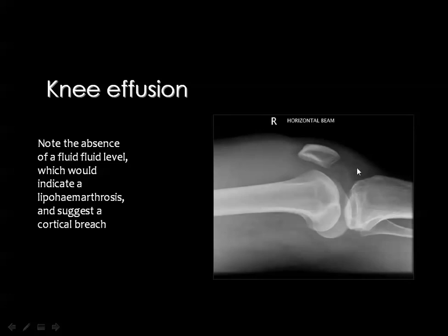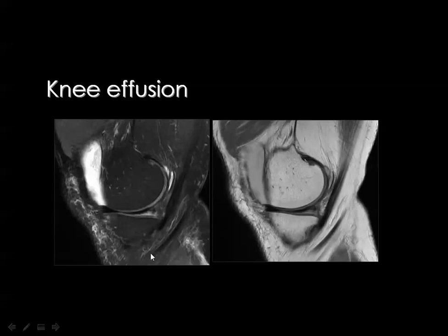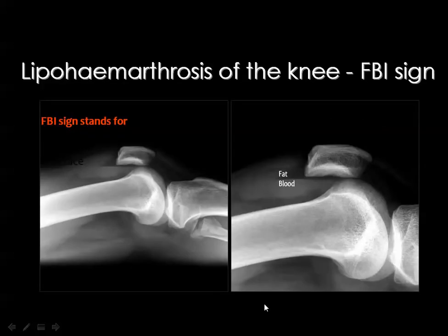You see this infrapatellar fat, and there is also suprapatellar fat which has been obliterated by the presence of fluid. But you can see this effusion by CT and MRI, and in MRI the effusion will be of intermediate signal in the proton density images and of high signal, of course, in the T2 weighted images.